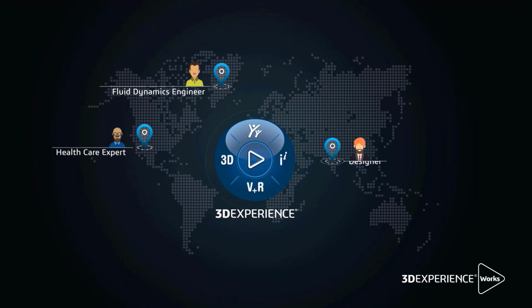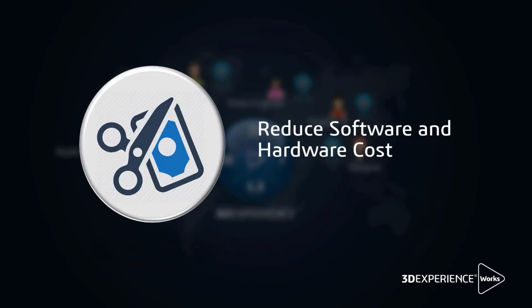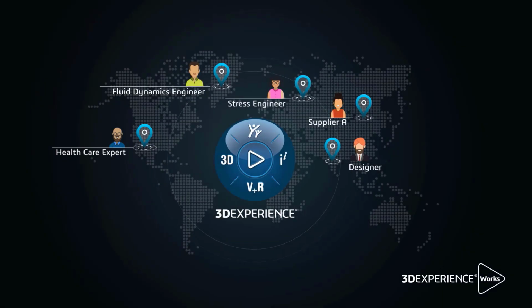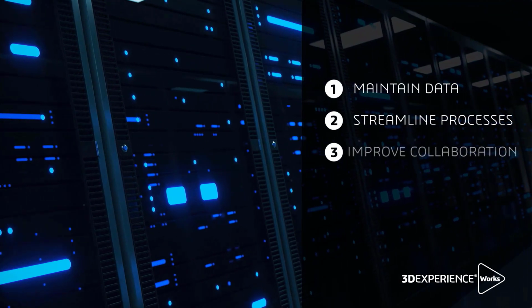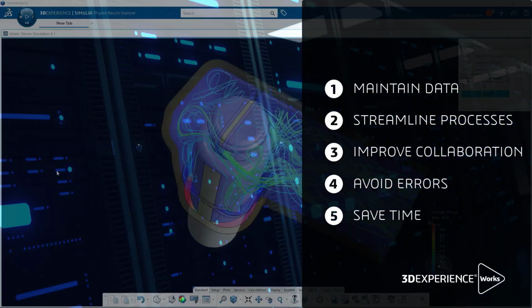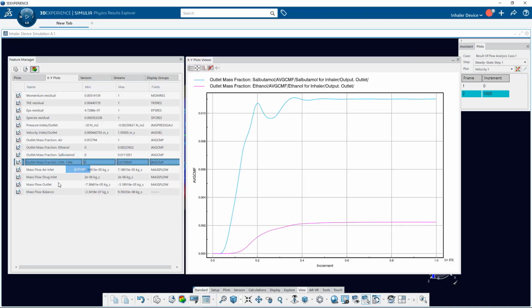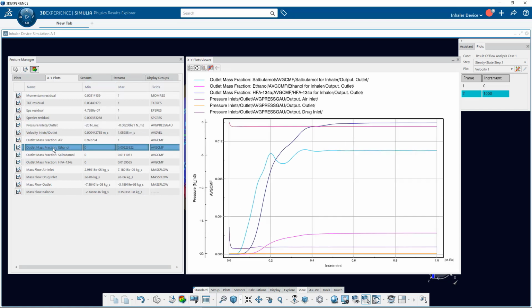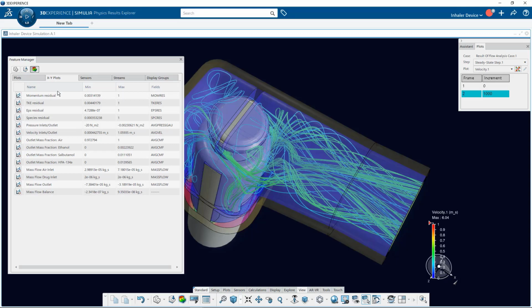The cloud-based collaborative environment on the 3DEXPERIENCE platform enables companies to access high-performance computing resources to solve computationally expensive simulations, reduce software and hardware costs for IT infrastructure, and maintain data consistency, streamline processes, improve collaboration, avoid errors, and save time on version control. The status of simulation can be monitored in real time by getting updates on engineering KPIs such as pressure drop and mass fraction in case of the inhaler, and standard solution convergence parameters like mass balance and momentum residuals.